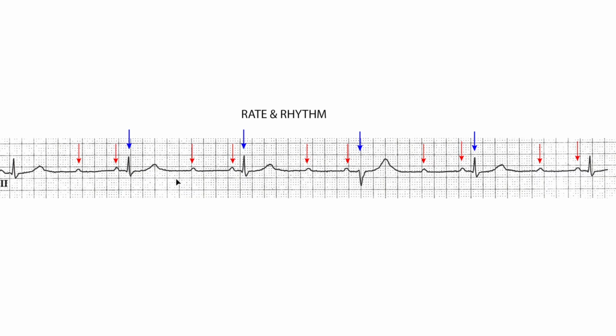Because immediately, this to me looks like a block, right? We're getting a P, and then we're getting a P, and it's not super fast. It's not irregular. It seems pretty steady. But what the hell is this? You know, why is there a gap here, whereas I should get more of them? It seems like there's a profound distance from this one to this one versus from this one to this one.